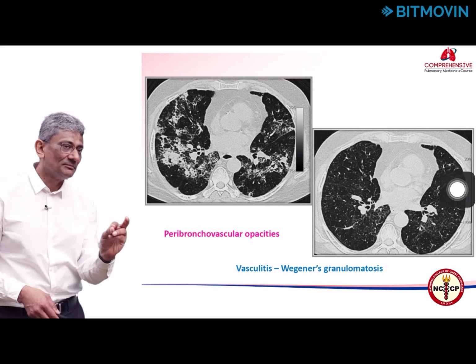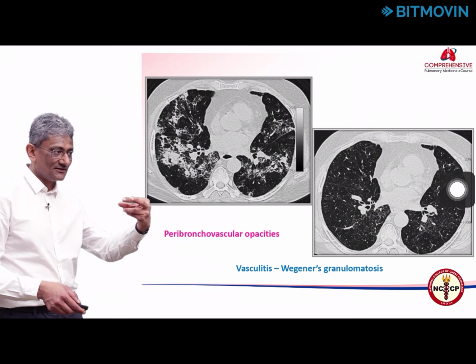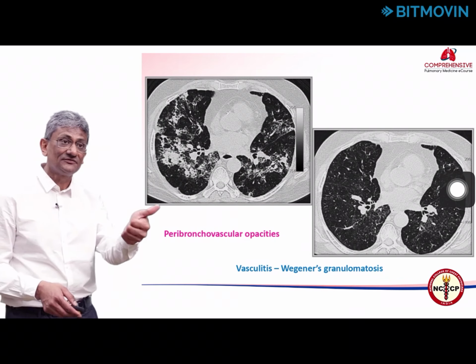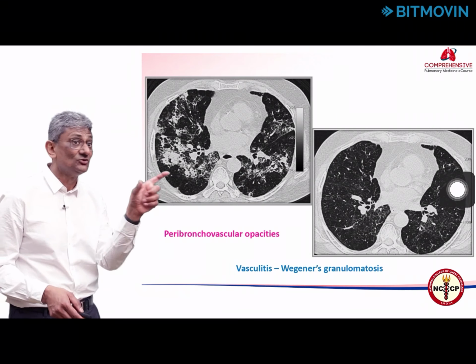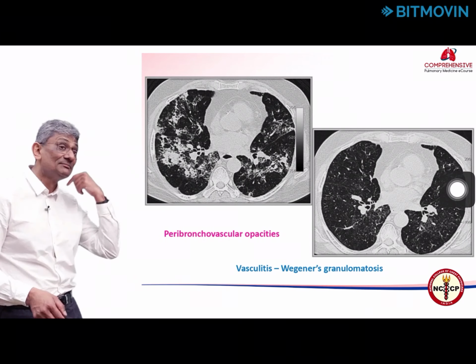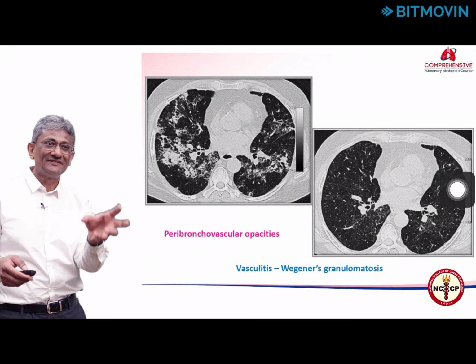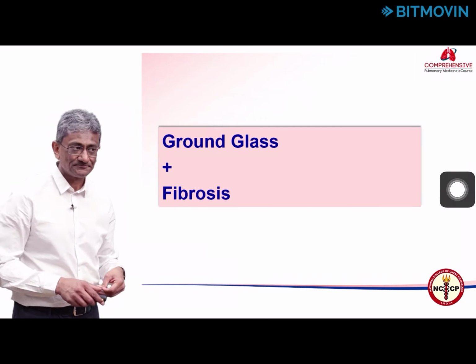So, when we see a combination of ground glass and consolidation, the commonest etiology, if we have the typical clinical presentation, would be an organizing pneumonia pattern, with the understanding that IgG4 disease and vasculitis can also behave in the same manner, and we do need to rule out vasculitis in almost all of these patients, and that similar patterns may occur in invasive mucinous adenocarcinoma or lymphoma, and obviously the clinical presentation is very important as well.